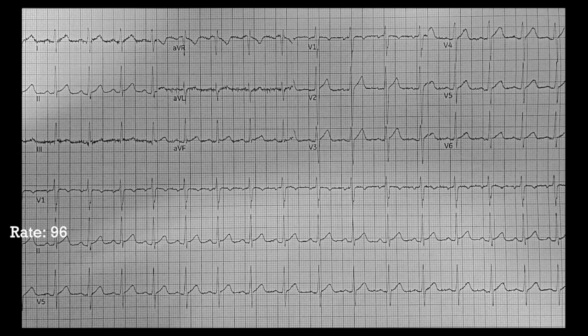So I like that second method because it gives you the true number of beats in a minute, or at least the true number of complexes in a minute. Whereas the other one, if this beat and this beat were actually really far apart, like in AFib, but this beat and this beat were real close together, depending on which one you measure, you could get a rate of 150, or you could get a rate of 80. So I like that one at the bottom, counting across and then multiplying by 6 myself, but you've got to kind of know how to do each one at least a little bit.